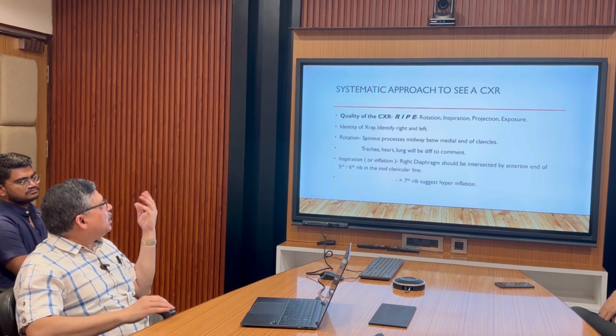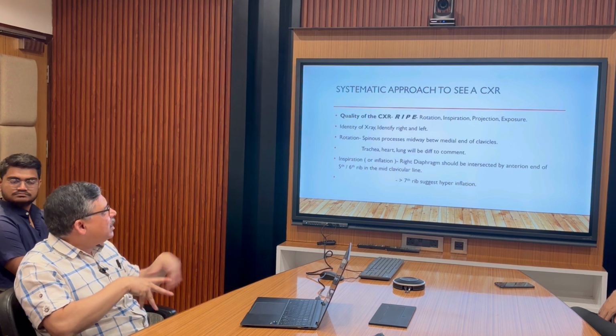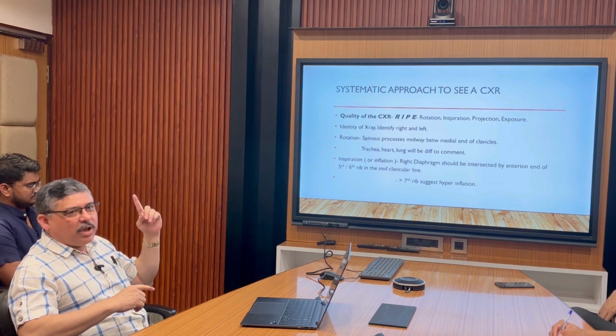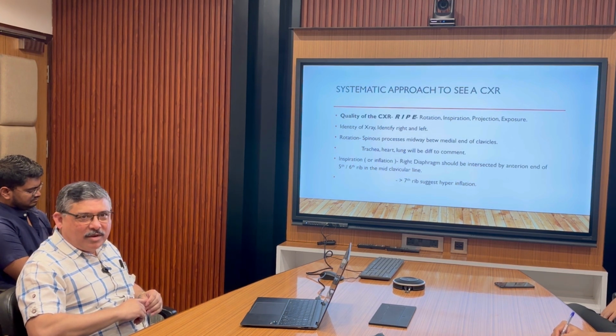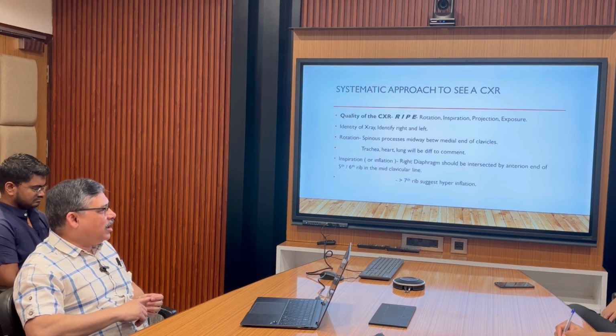So what is the quality of the X-ray? What do we see in the quality of the X-ray? The mnemonic is known as RIPE, R-I-P-E. You see the rotation, you see the inspiration, you see the projection and the exposure. It is easy to remember that way, RIPE. So what is rotation?